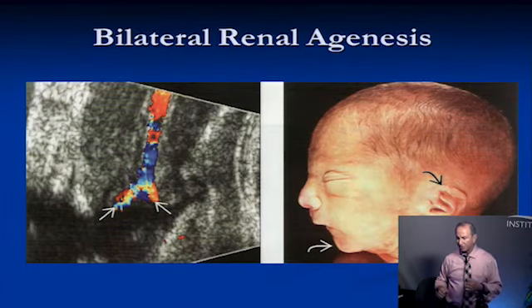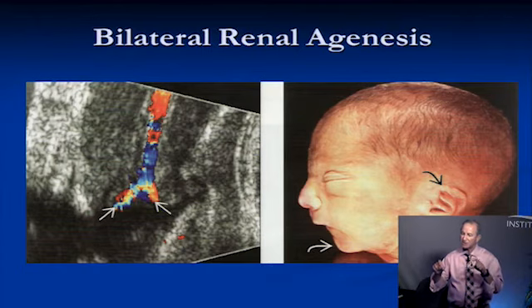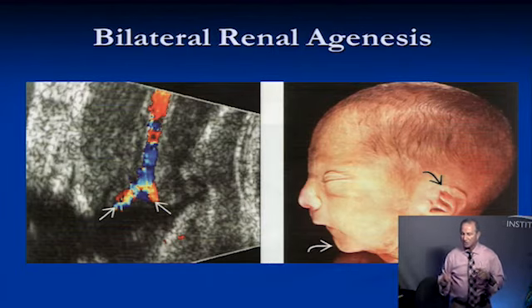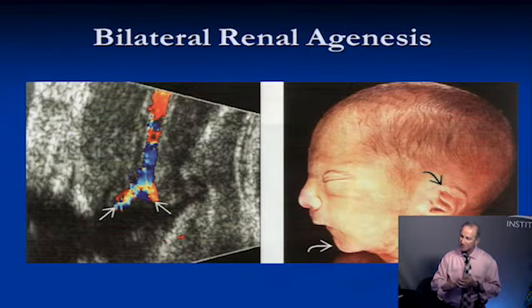Then you look at the abdomen. You look at the kidneys. Do we see normal kidneys or not? If I see normal kidneys, because you should see renal pelvis at least 3 millimeters or so if she's ruptured membrane and the kidneys are normal. But we don't see kidneys at all. Now, there is a little mistake here. When the kidneys are absent, what's above the kidney?